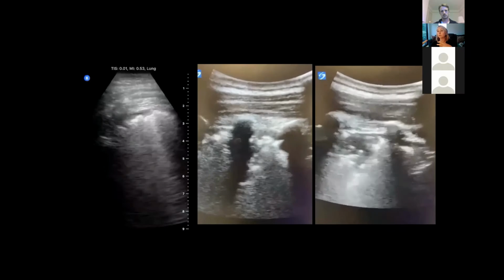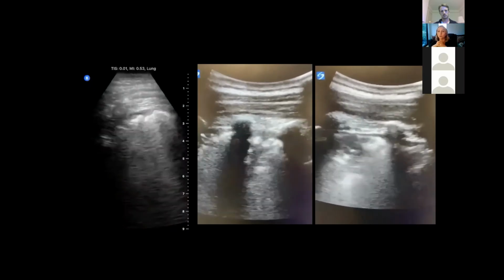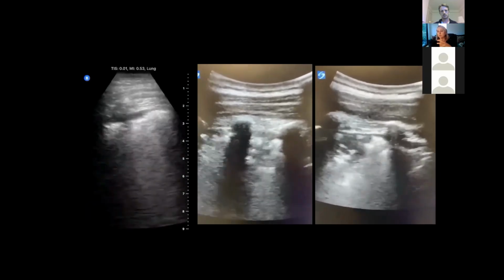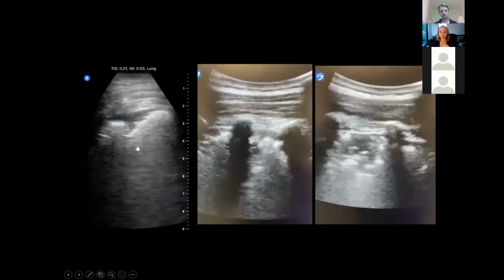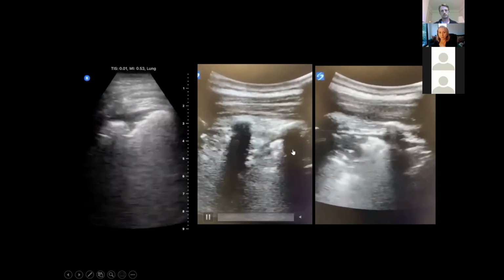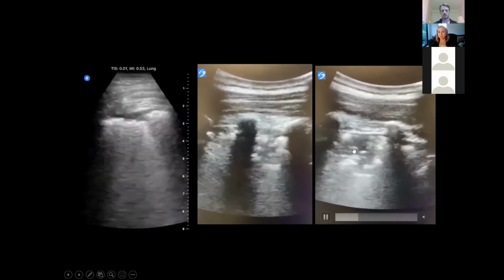Really what they are is peripheral consolidation, because anything that's deeper in the lung with an air pocket outside between it and the pleura will not be seen by ultrasound. But viral pneumonitis, viral pneumonias like COVID-19 tend to be quite peripheral, so it lends itself quite well to ultrasound. But here in the middle in particular, you can see these fluffy cloud-like appearances of consolidation. There's much more thick looking pleural line. And we've got a bit of hepatization on that right one as well.